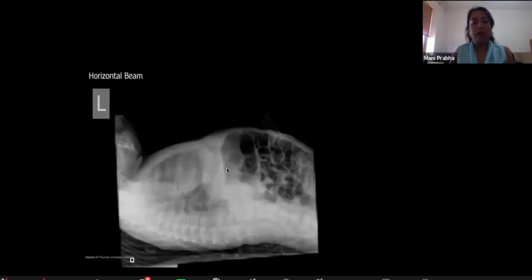Can I take you back to this one? In this one, examiners like to ask what's the advantage of keeping the patient supine, or what's the advantage of keeping the patient in lateral position? Do you know about this?